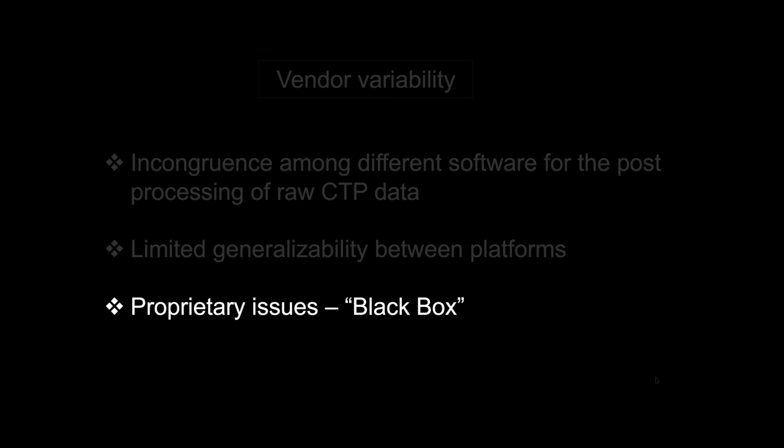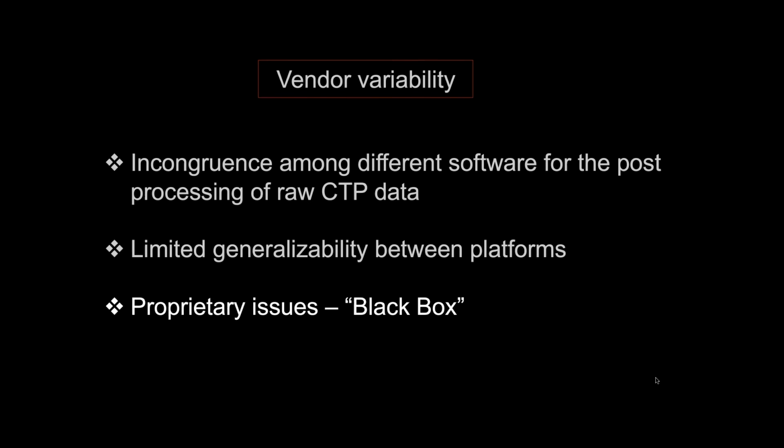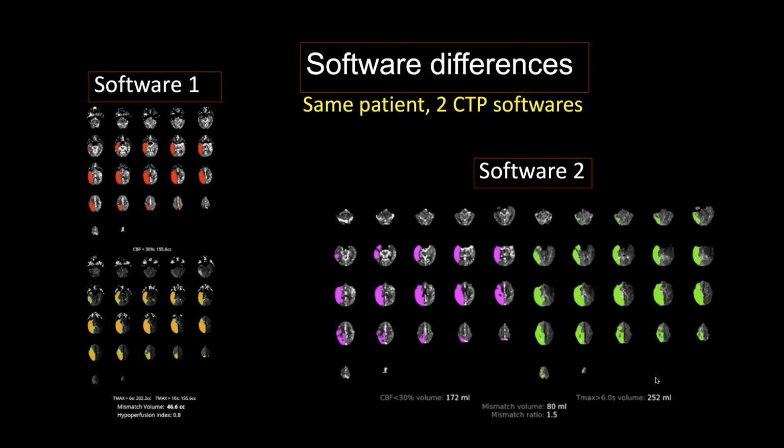And of course, there are proprietary issues of black box, right? There is going to be vendor variability. So here is an example. At our institution, we actually looked at a couple of these softwares. So this is the same patient, the same CTP study processed by 2 different softwares.